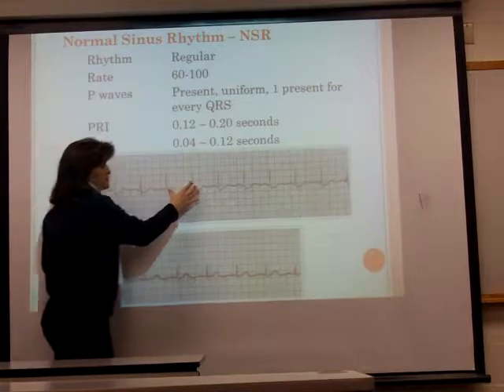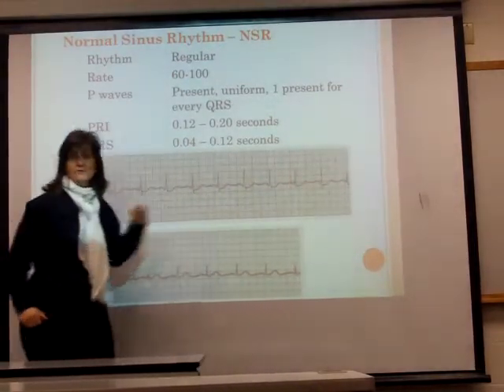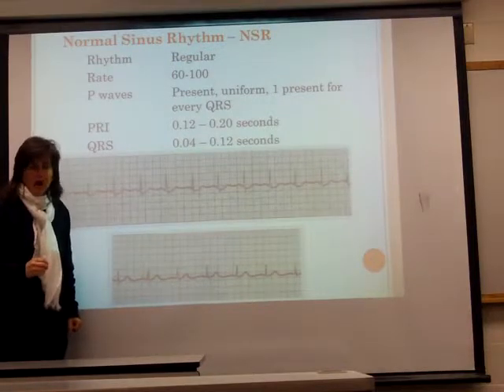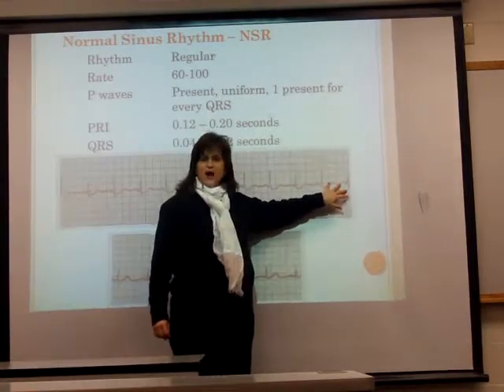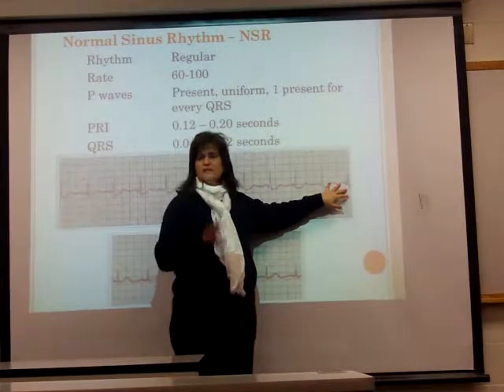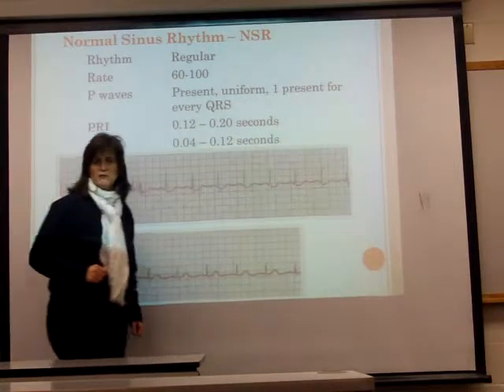from the left to the entire right side of the paper. And what you'll notice is it's very regular. It is not uncommon by the time that you end up here that you might be off by just 1 small box. That's very common. It's not a perfect world, but that would be a very regular rhythm.